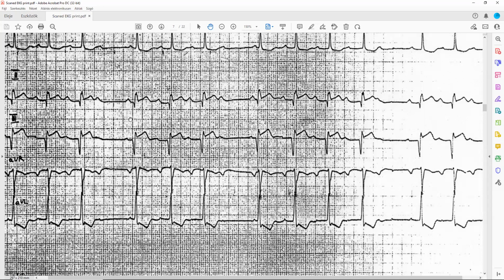If you go step by step, please. That's a P, QRS, P, QRS, P, QRS, P. Where is the QRS? There's no QRS. Oh, yeah, I didn't see that bump. There's a T and then there's a P. So we do have a P wave that is not followed by QRS.